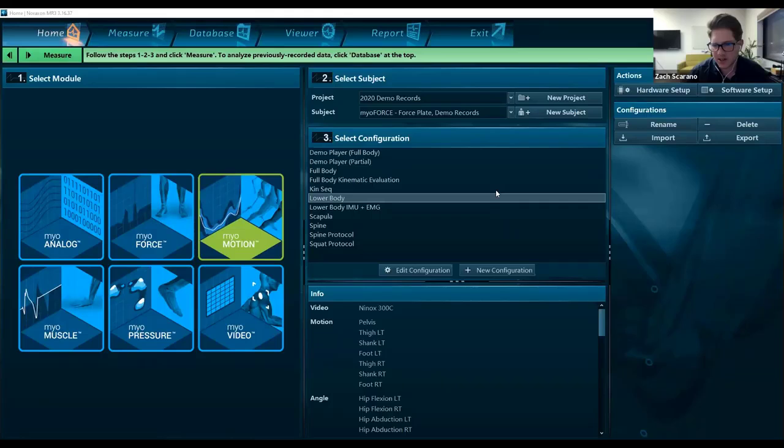In this particular discussion, I'm going to be just going over how to customize reports and some of the different options that are available within the report customization process. And hopefully this will give everybody a little bit more understanding of what those options are.